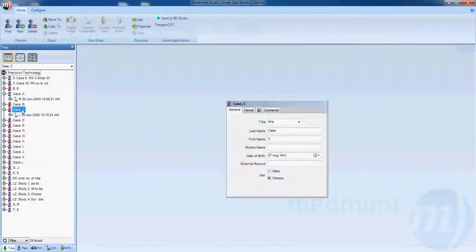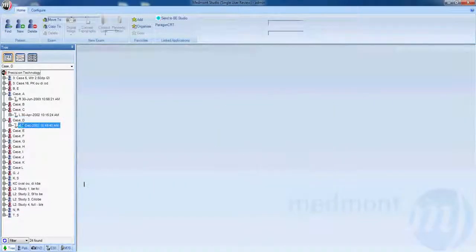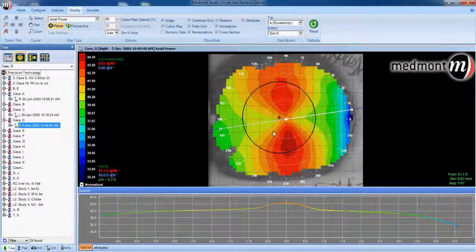Compare that to this particular patient where you see against the rule corneal astigmatism of a very similar amount of corneal cylinder, 1.6 diopters on this against the rule eye. But again, we see centralized corneal astigmatism. Compare this apical or centralized corneal astigmatism to what's described as limbus to limbus corneal cylinder or astigmatism. In this particular case, the figure 8 or bow tie is not centralized to the pupil. It very much extends from one side of the eye to the other.